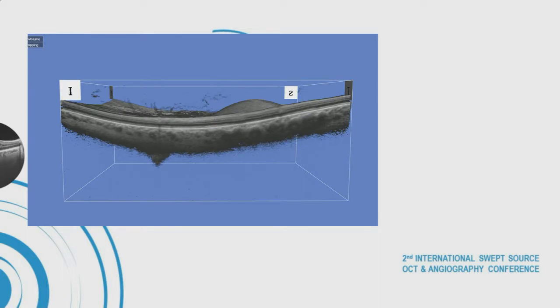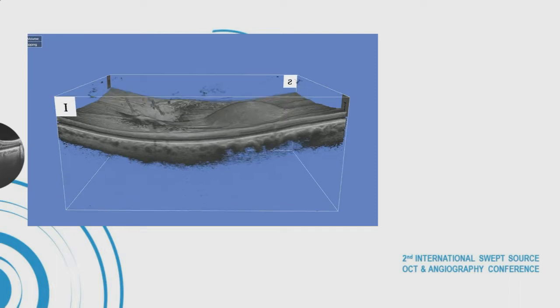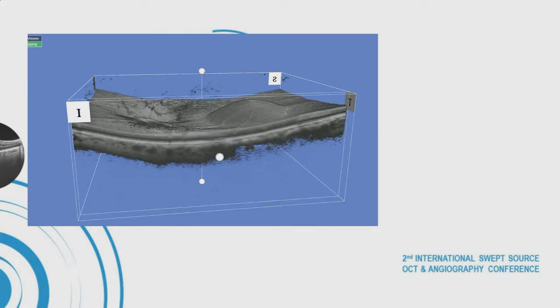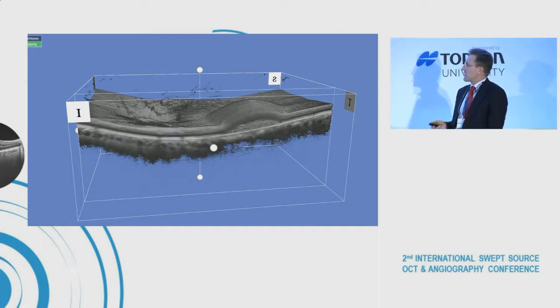And we can turn it step by step, as you will see at the exhibition. And here's that huge bulge seen from an angle as though we were standing inside the eye. We can rotate it a little bit, a trick that can be used to produce stereoscopic images. We can put handles on it, and then we can peel away layer by layer as though we were slicing bread. And here you see the cavity from the top of the eye.